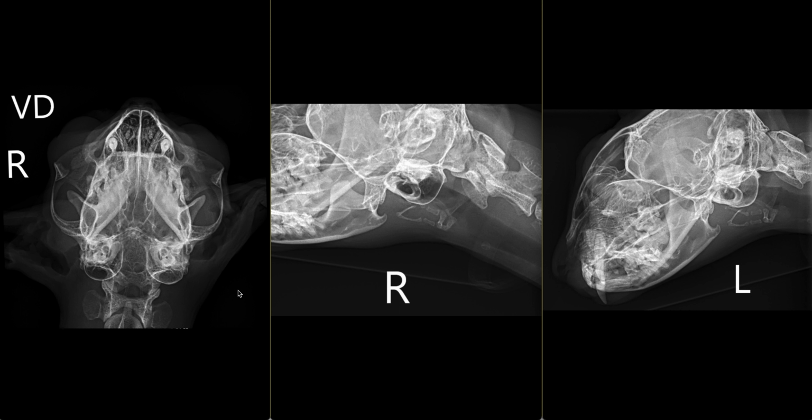Our findings for this case include opacification of the left tympanic cavity. Primary consideration would be given to a middle ear effusion, and this can be due to either generalized inflammation or infection, such as otitis media. There is mild thickening of the left tympanic bulla. For this, we would consider mild osteitis that can be secondary to chronic inflammation. And the right tympanic bulla is unremarkable.